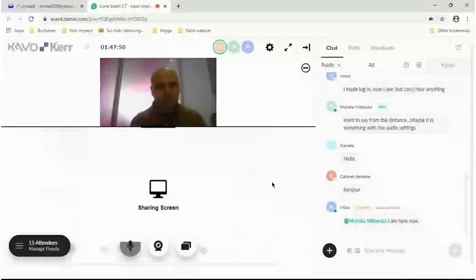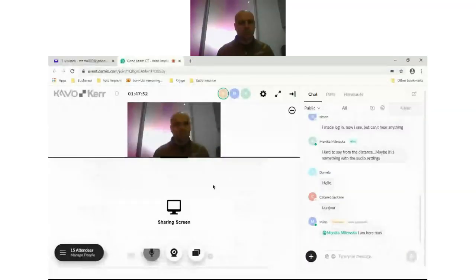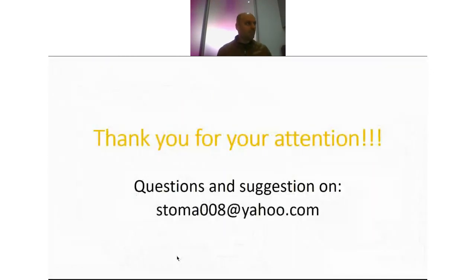Because we do not have a time constraint, I can stay for a few minutes live, and I hope that there will be some questions, because especially the end, this part with overlapping the radiological and prosthetic data, can be a little bit confusing.